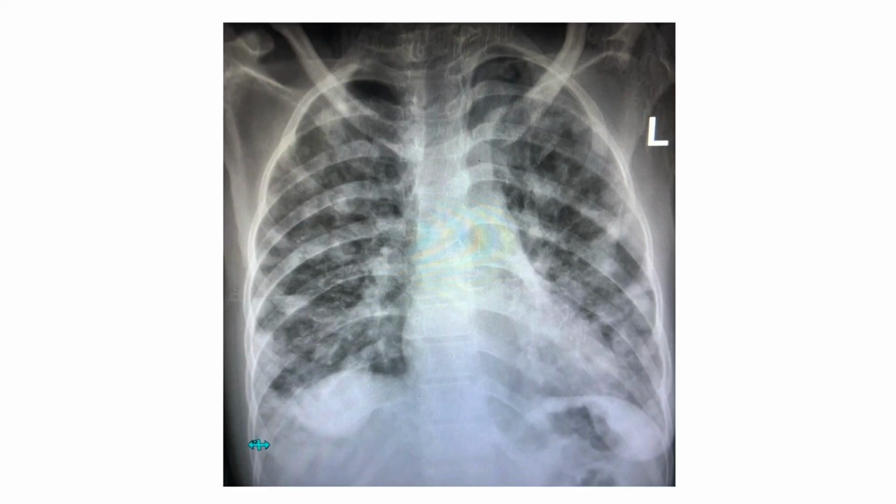I'm going to give you five for this session. The second last is what I'm going to look at right now, and the second last report, of course, is derived from also one of our patients here. Most of these cases are actually real patients, and we derived them from our archive. Again, the first thing that I wanted us to notice is when you look at this X-ray, you need to look at it and conclude, what am I dealing with here?